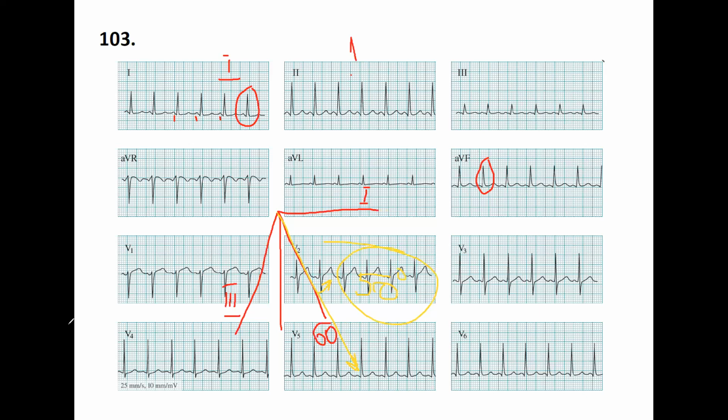Okay, so it's still normal, doesn't matter. So maybe they are not asking you what the axis is, and especially the gadget will write you the data immediately, so you don't need to hesitate, you don't need to calculate the axis. But here for the midterm, you have to.